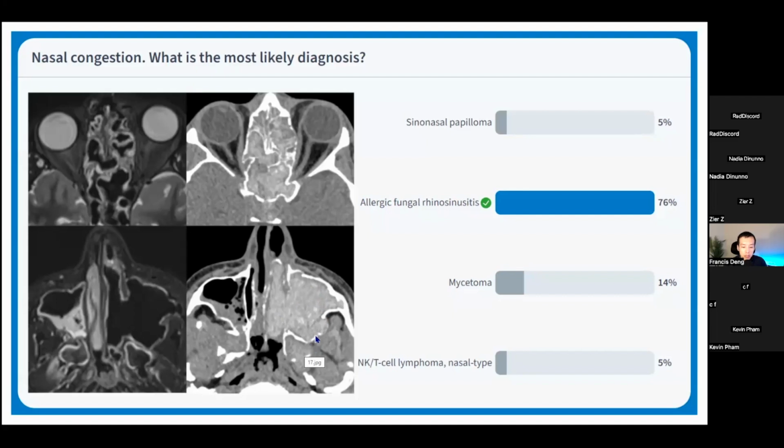There's bony remodeling of the posterior wall of the maxillary sinus, protruding into the infratemporal fossa here. It's not infiltrative. It's not causing much edema in this retroantral fat, but it is remodeling the bone and bulging out. And it's really hyperdense. So what is that hyperdensity? Don't confuse it with contrast enhancement. Notice that the carotids are not enhancing on these images.